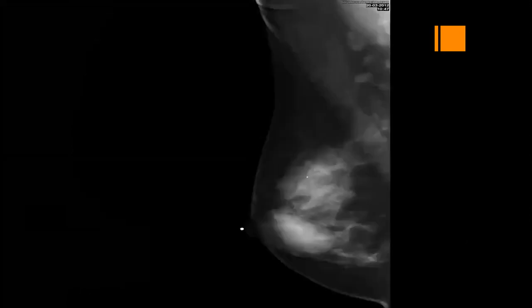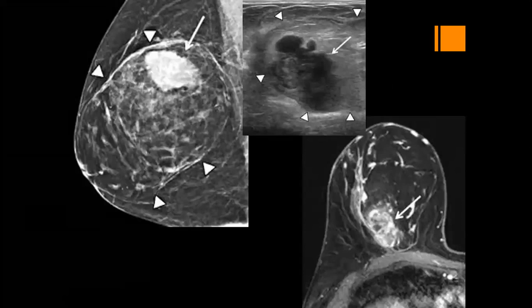The margin of the previous lesion, how can we describe it, microlobulated, or how? On mammogram or ultrasound? Here, this is spiculated. Here on ultrasound, microlobulation.